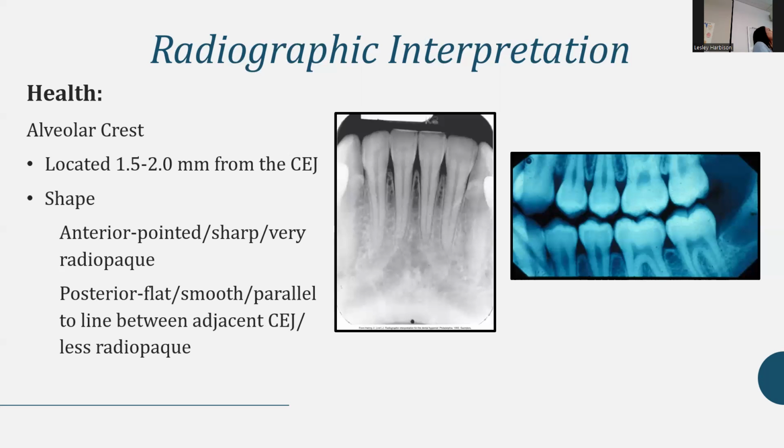I just want to say, Allison Santoro, about how to calibrate it, because you can pull up a radiograph and measure, you can pull the ruler and put it at the CEJ and then put it down to the alveolar crest. But the measurement it's giving you right now is not calibrated, so I don't think it's accurate. I've tried it a couple times and I was like, I don't think that seems quite right. So I'll see about talking to Professor Santoro about that.